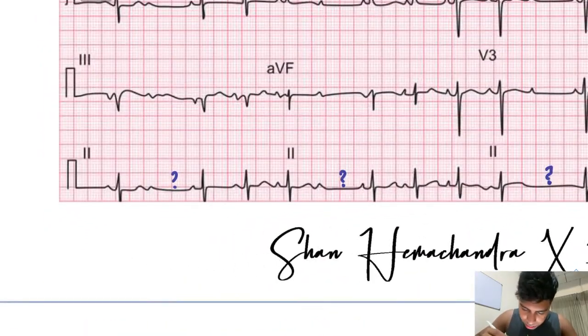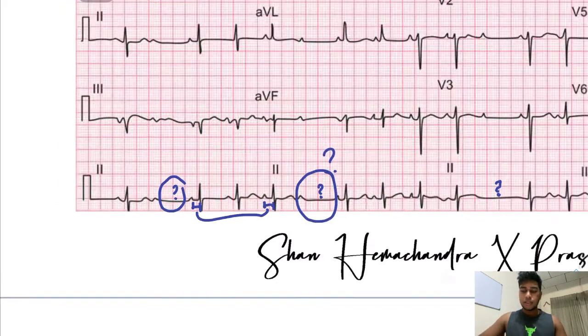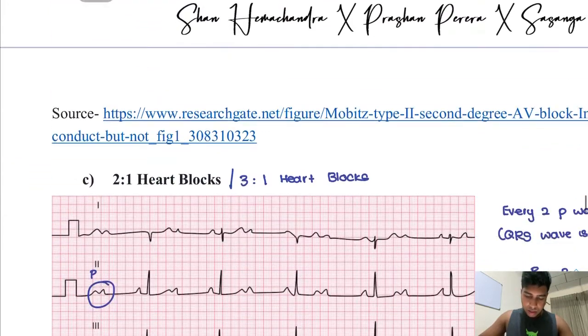Okay, look at this. You can see the gap. You can see the gap. There's no wave here. You can see these gaps are constant. Then there's no wave here. Okay, you can follow the wave and you can check it out.